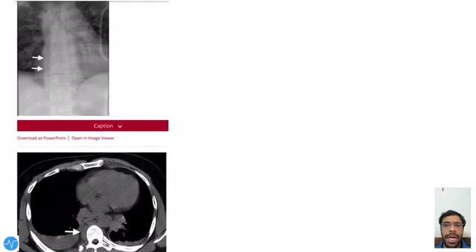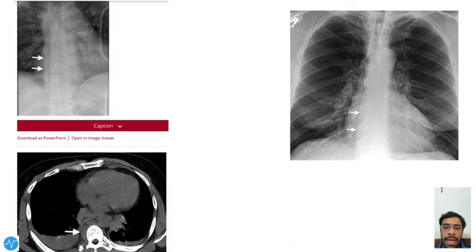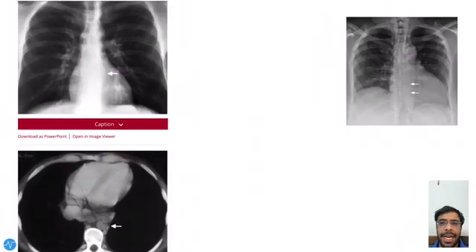See how abnormal will be seen. Again, abnormal will appear as a convexity. Here you have a diagram of normal also for comparison, where the paraspinal line was straight, but here a little bulge is seen. We can see the left paraspinal line.